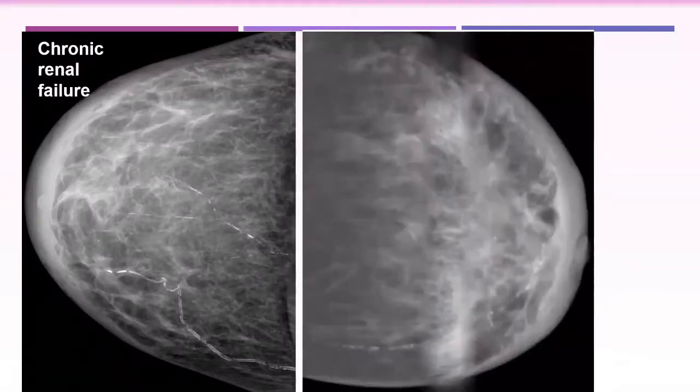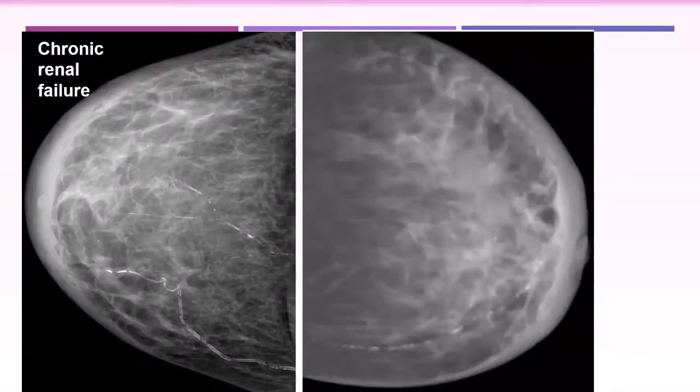And this one, more or less the same. But it is inflammatory carcinoma. So these are mimickers. We have to think twice about these causes of edema.